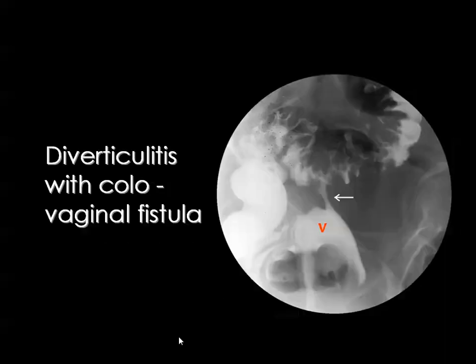see in this case. Also, diverticulitis may result in fistulous communication, commonly with the urinary bladder, and less commonly with other pelvic organs and even with the skin. And here is an example of diverticulitis with a fistula tract connecting the colon to the vagina.